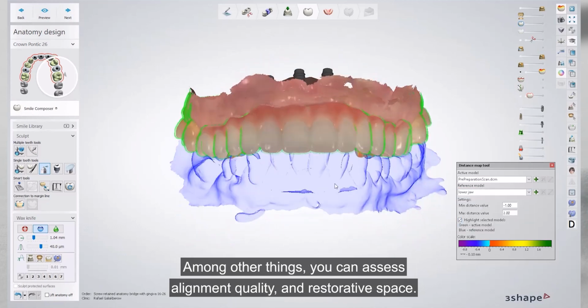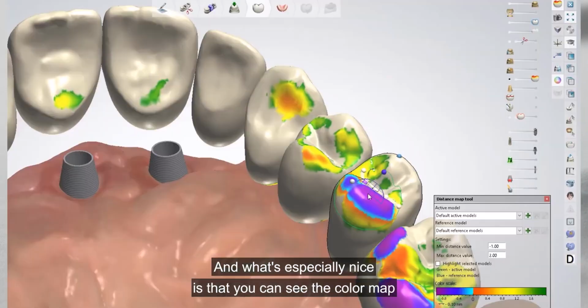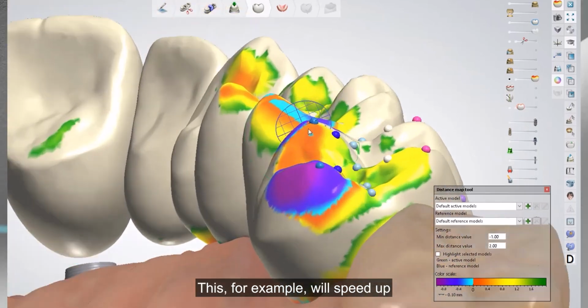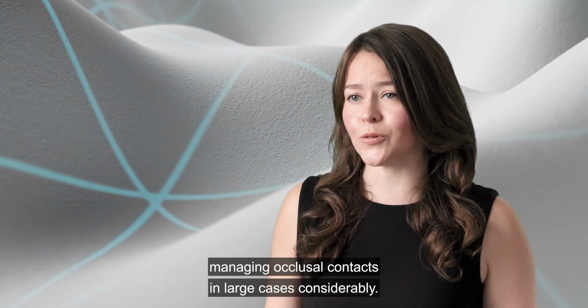Among other things, you can assess alignment quality and restorative space. And what's especially nice is that you can see the color map reflect changes that you've made pretty much instantly. This, for example, will speed up managing occlusal contacts in large cases considerably.